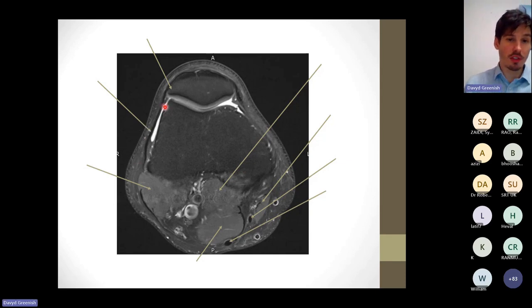So we're talking about this structure. Yeah, perfect. So iliotibial band. So I've said the iliotibial band is a lateral structure. So now you've almost unlocked the knee as it is by just determining which is lateral, which is medial. And then we've got the lateral facet of the patella, or the lateral aspect of the patella. As we come on to the other side, we've got our medial structures.